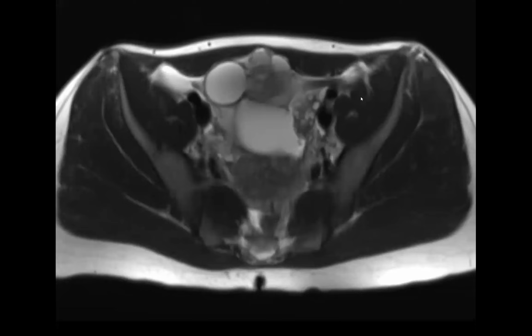Even if you're getting an abdomen, trace the colon, and these can help and improve patients' lives. It was a really great pickup. That might even be more impactful than a small HCC or something. Yep, exactly. Okay.